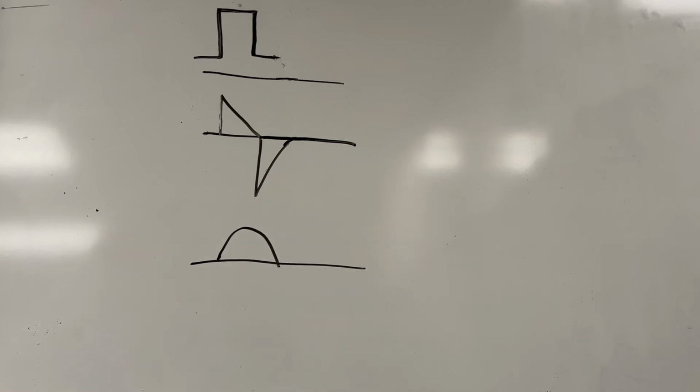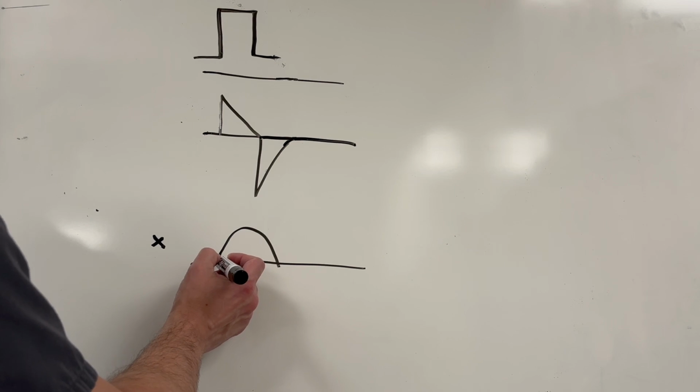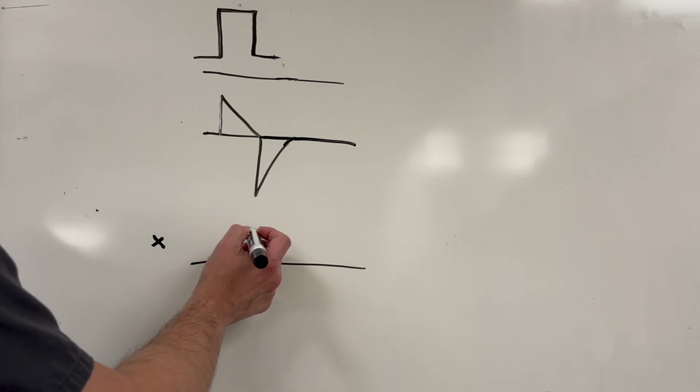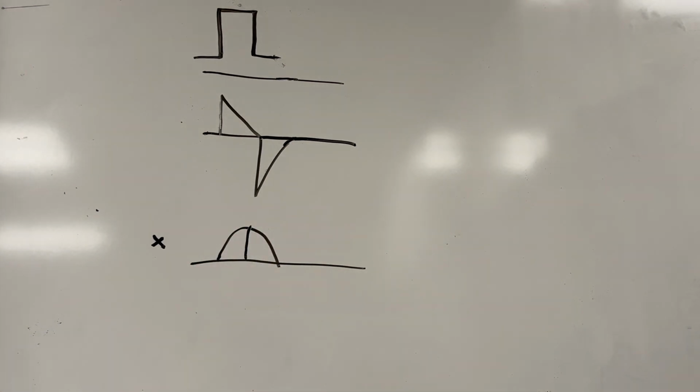Now we're going to go over what it looks like if your patient has a leak, and where you'll see that is on the volume waveform. So again, you have your inspiratory volume being delivered to the patient on this side, basically the first half of this. Leaks are going to occur on that inspiratory phase of the breath. As we're pushing in flow, flow is leaking out somewhere.